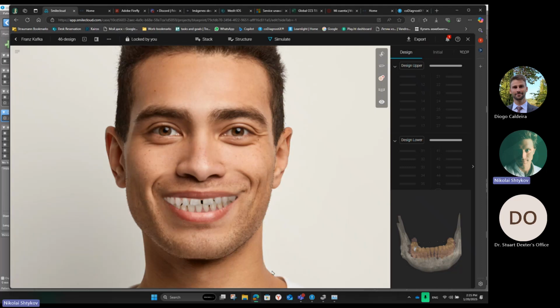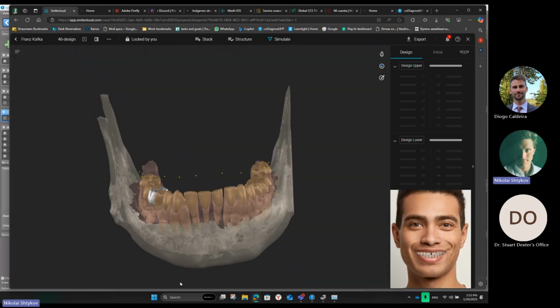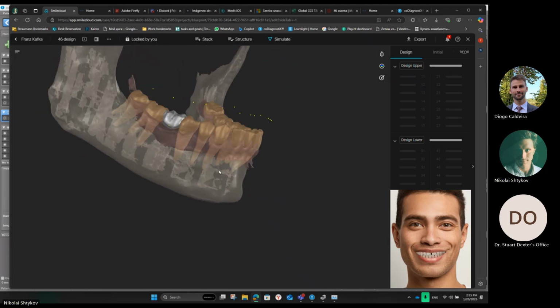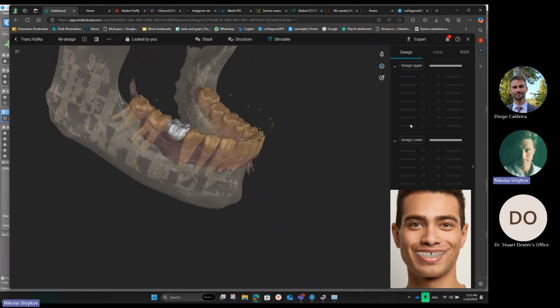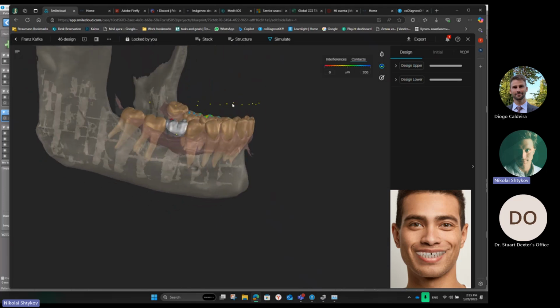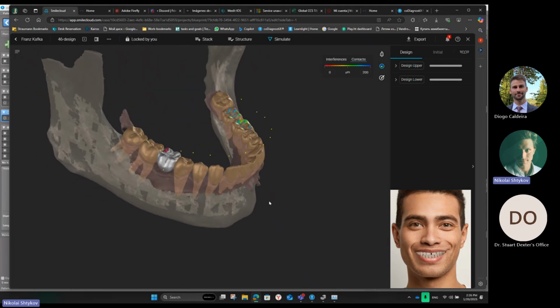So we see here that we didn't change our smile, but I planned here our missing tooth. And when I planned this missing tooth, I also orientated it by the bite and by everything. So I can see that everything is correct. Today is not SmileCloud training. That's why I just show you how to export this file.